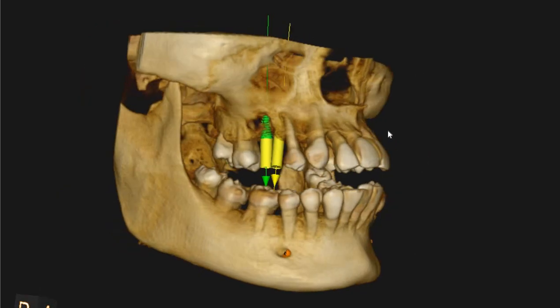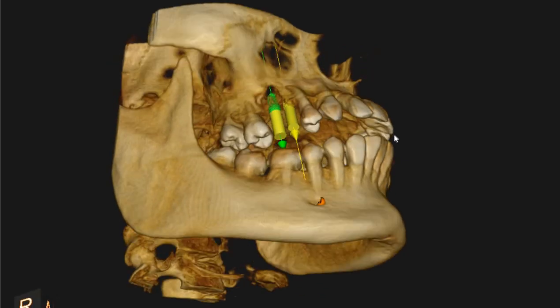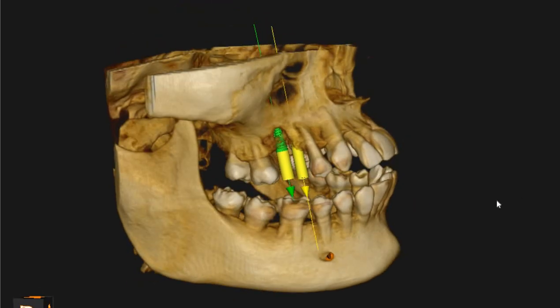We will also share an implant planning report. The bone quality in this region, however, is very poor, and both sinus lift and bone grafting is definitely advised in this segment.